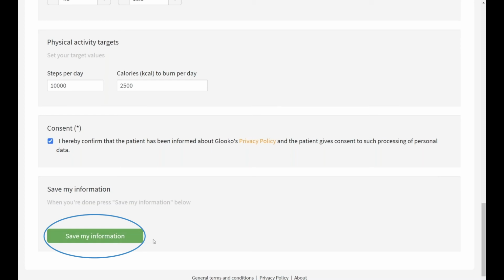Now it's at this point that an email would be triggered to the patient where they would then be asked if they would like to share data with Novo Nordisk. They can choose to opt in or withdraw their consent at a later date. By default, a patient is not opted in to sharing data.